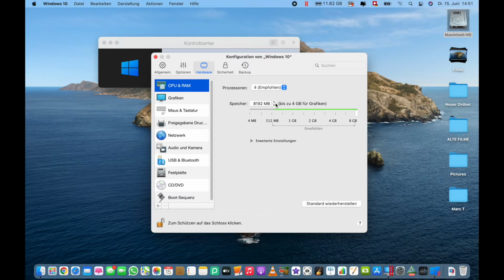Make sure you keep the RAM to the maximum, which is 8,192 megabytes or 8 gigabytes. My system here, my MacBook Air, has a total installed of 16 gigabytes. If you had one with 32 gigabytes, it will let you choose 16 gigabytes of RAM. However, 8 gigabytes will run the ActiveView even in high speed appropriately. It will run it well.